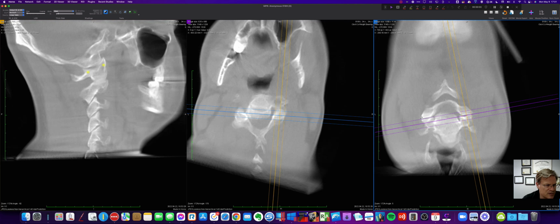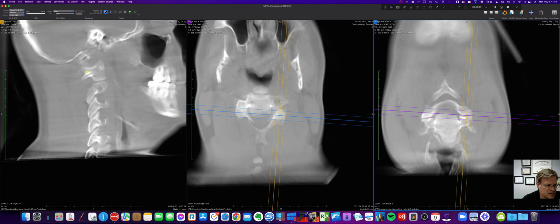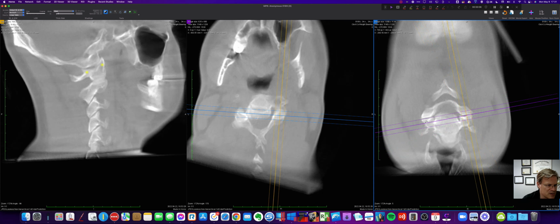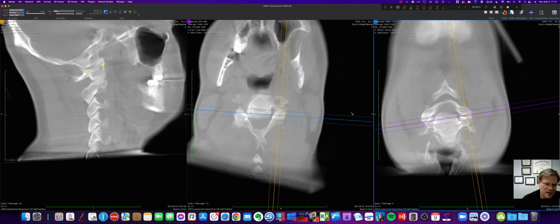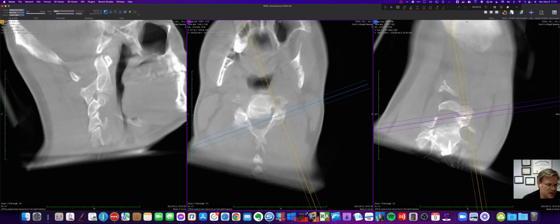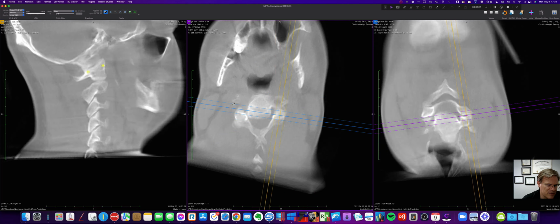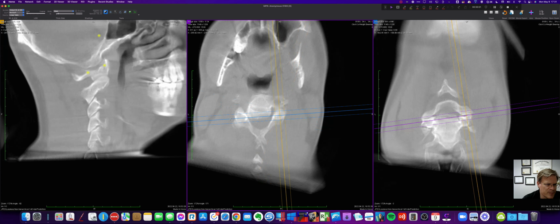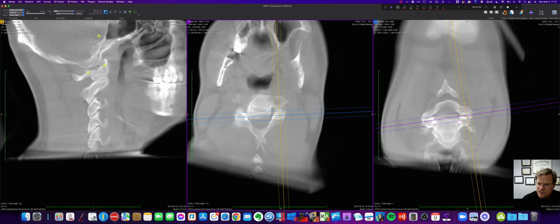Pretty good. I can tilt it back and forth. Possible posteriority there. Another thing that we can do is rotate the joint. And often when I'm looking at the IVFs, I'm looking at this too. That's a distinct possibility for a posteriority. We can just keep on going down and doing that.